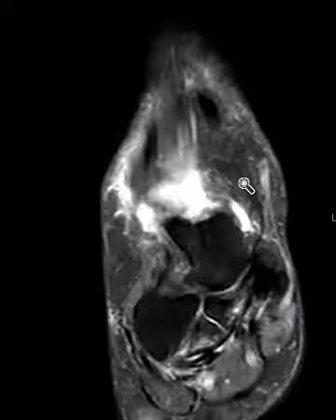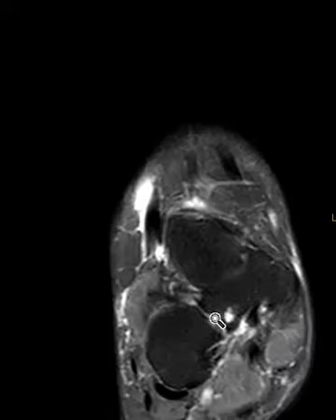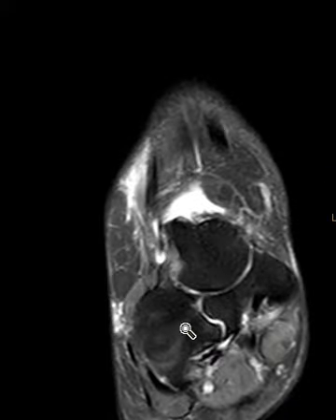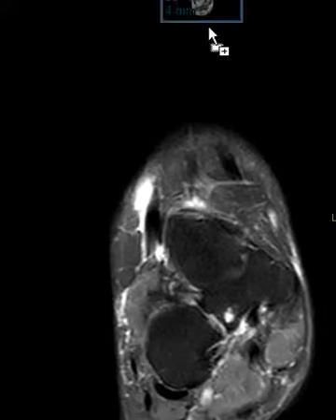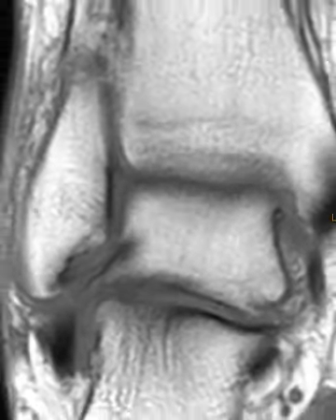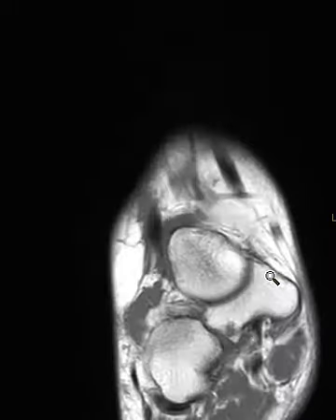So that's one finding. But there was one other finding here, which we can see on this view. Down here there's an abnormal, anomalous articulation between this bone and this bone. Let's try to figure out what those are. Let's slide this one back here. And this is a T1 weighted image. We should see this a little bit better here.